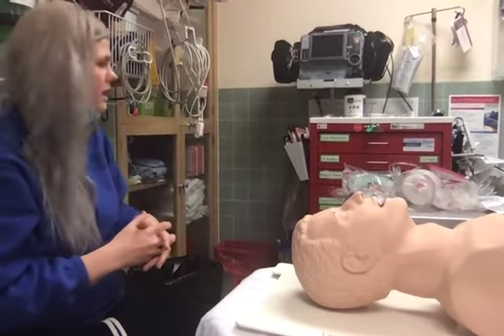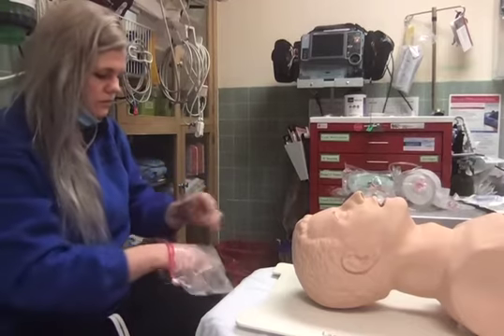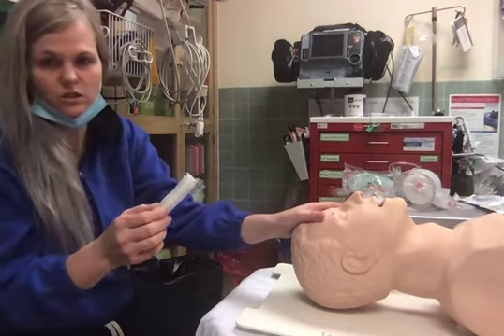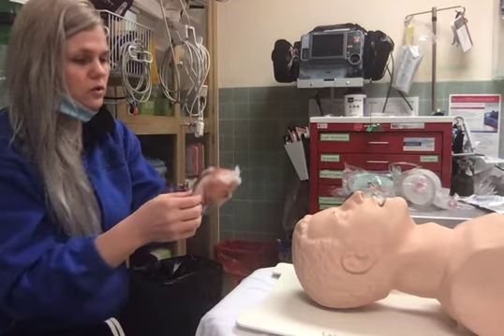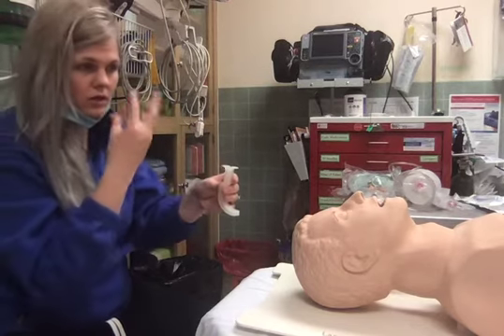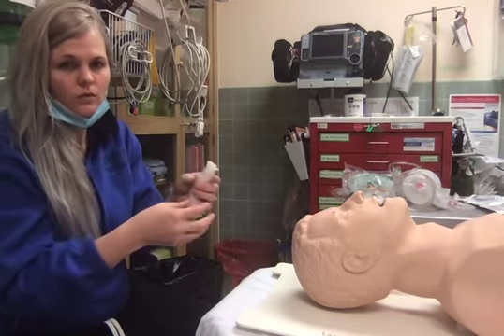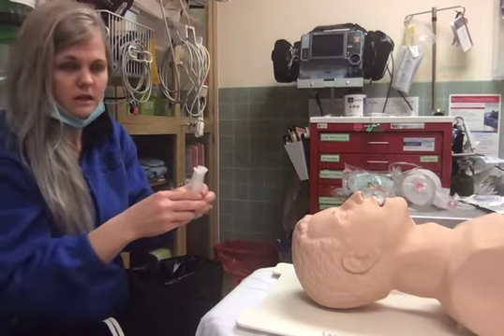So to begin, we have our most basic, if you would call it that. These are called oropharyngeal airways. These are used for unconscious patients, or rather patients that don't have a gag reflex. These are used to establish a tract of air, essentially. When someone is unconscious, their tongue gets very floppy, and this kind of pulls it all forward. Obviously, you can only use it with people without a gag reflex, like I previously stated.